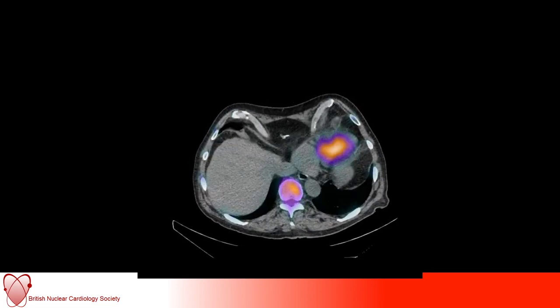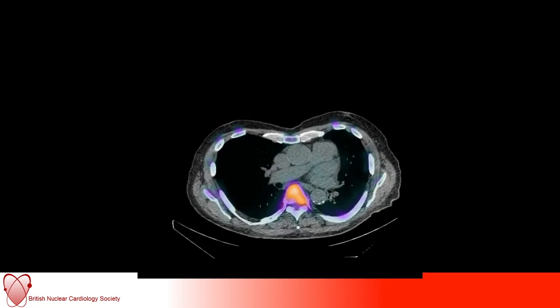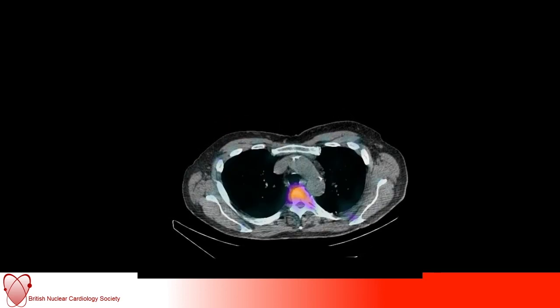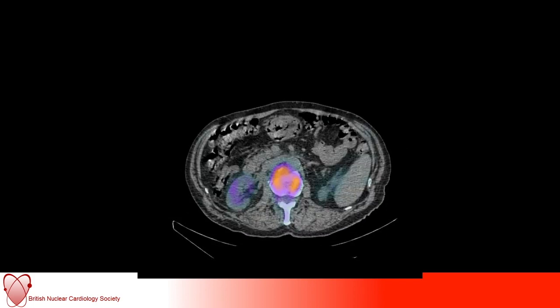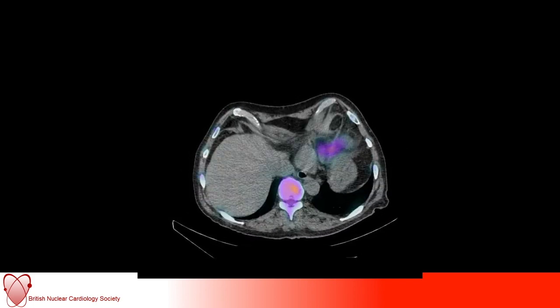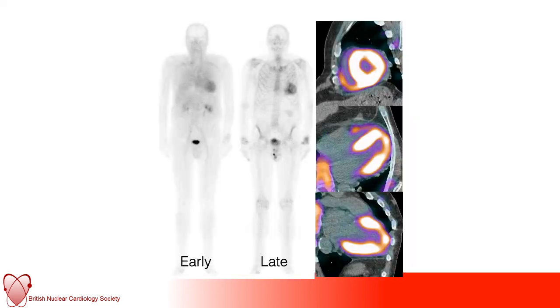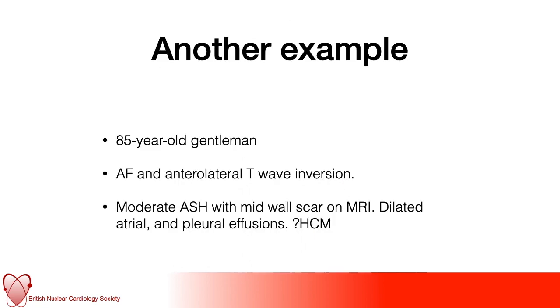Looking at the SPECT CT again now to confirm, or as we say, refute the diagnosis, but here you can see clearly this is lighting up very, very nicely, and this is one of the many reasons I enjoy nuclear cardiology. You don't have to squint and decide whether it's positive or not. This is lighting up very clearly like a Christmas tree, and this is a very positive scan. And they're just the sort of still images to show you in the same patient.